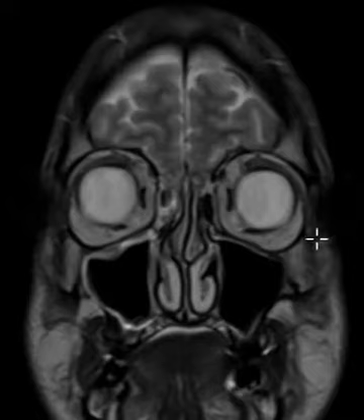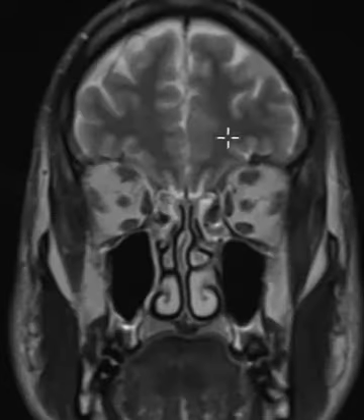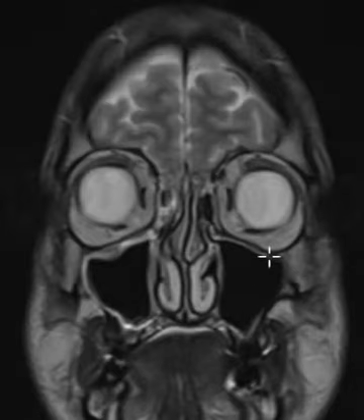And this is an MRI of the brain where we can see the right eye, left eye, the brain parenchyma is up high here. Down below is the tongue, and we see these two areas that are dark. This is the right maxillary sinus. Here's the cheek area, here's the left maxillary sinus. And in this patient, the brain was completely normal, but he did have some mucosal thickening in his sinuses.